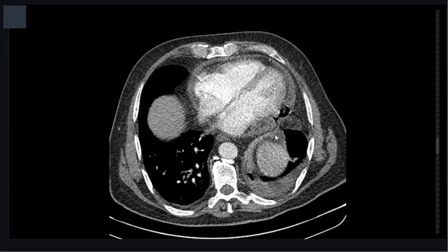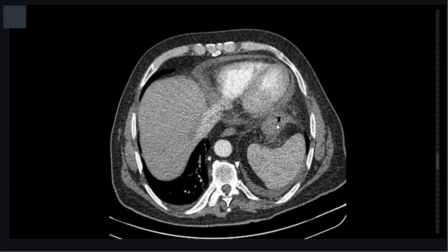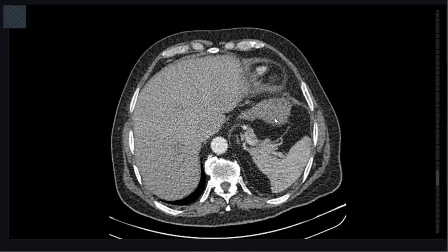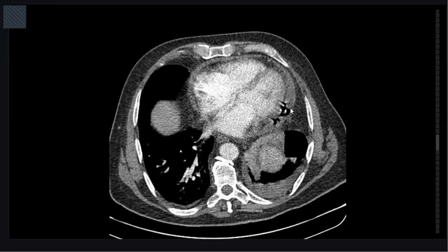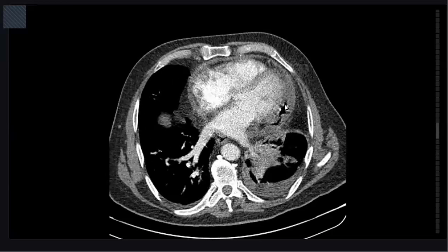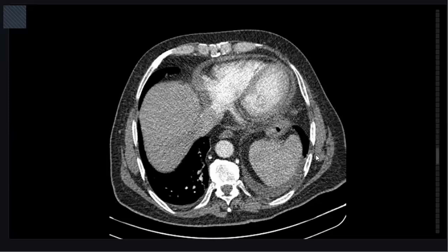So you can go here to the stomach. You can see the connection between the stomach and the pericardium, so it is a gastropericardial fistula. It is also an emergency, with pericardial effusion and pneumopericardium. There are also multiple pleural effusions, lung collapse, and all things like this. So try to search for the cause of anything you can see.